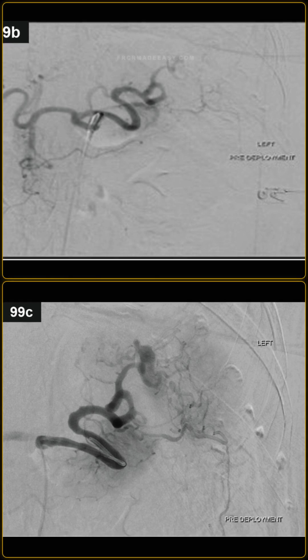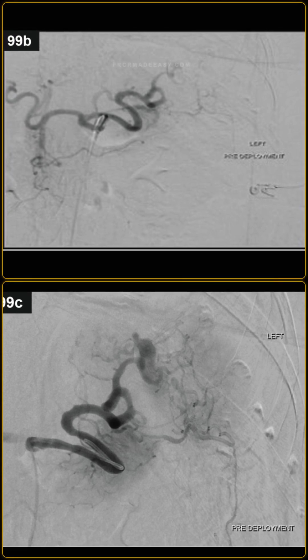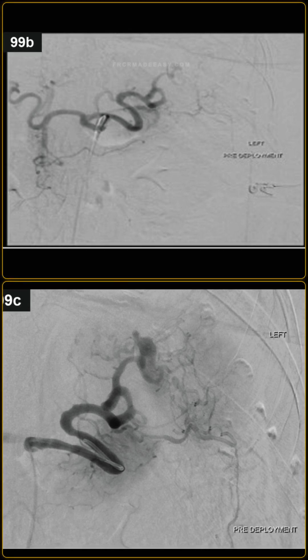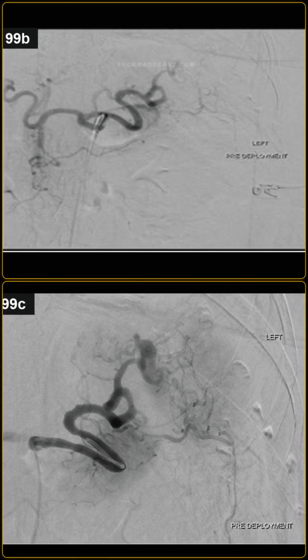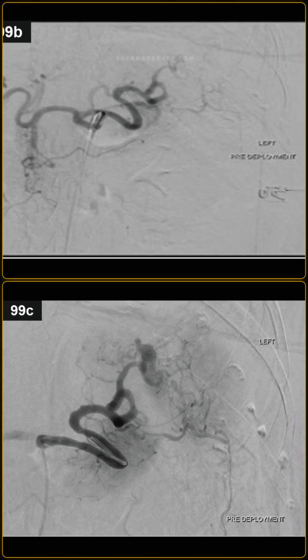I am showing you catheter coeliac angiogram images. What do they demonstrate? Okay. The catheter angiograms show a large aneurysm arising from a highly tortuous splenic artery in the left upper quadrant. There is a focal defect at the inferior wall of the aneurysm calcification. This is associated with active contrast extravasation, confirming ongoing retroperitoneal or intraperitoneal hemorrhage.